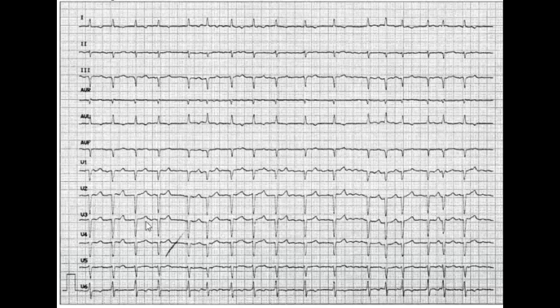One other thing that you have to note is that we can do ST. The ST segments are all isoelectric. There's no pathology in them. T waves here are hard to differentiate from the P waves, so you can actually say for some of them, at least, that you cannot differentiate. But there's also no pathologies here in T waves. The QT interval is also normal. It's 0.32 seconds.